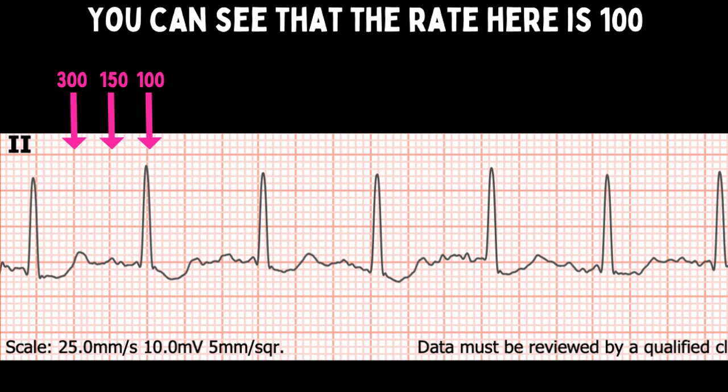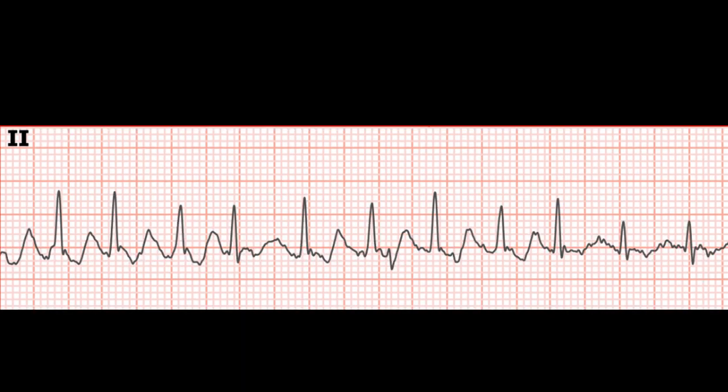300, 150, 100, boom, 100. Beautiful. Here's one that's a little faster.